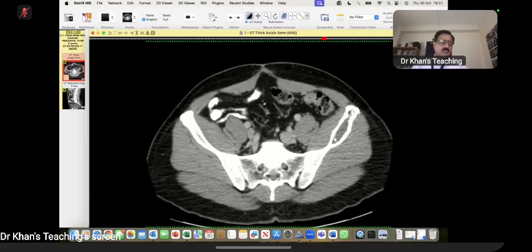So I could have asked you a leading question. Can it be malignant? This will be my question. And you have to stay firm. So say that the lesion is very well defined. It has got thick marginal sclerosis, and these are features of a benign lesion. There is expansion of bone. There is no destruction of bone. This is in keeping with a benign lesion. I'm not worried about malignancy. So stay firm. And this is another technique of the examiners: they do check your confidence.